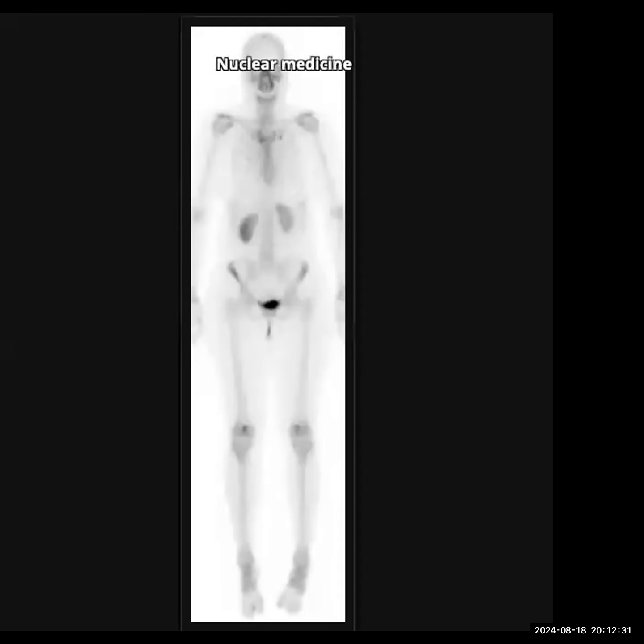This is your next case. Okay, I'm provided with a nuclear medicine study of the whole body. I can see there is uptake within bilateral kidneys. Thinking this to be a technetium 99 MDP scan. I'm not able to see any uptake within the ribs or the long bones. There is mild uptake in bilateral distal ends of the femur.